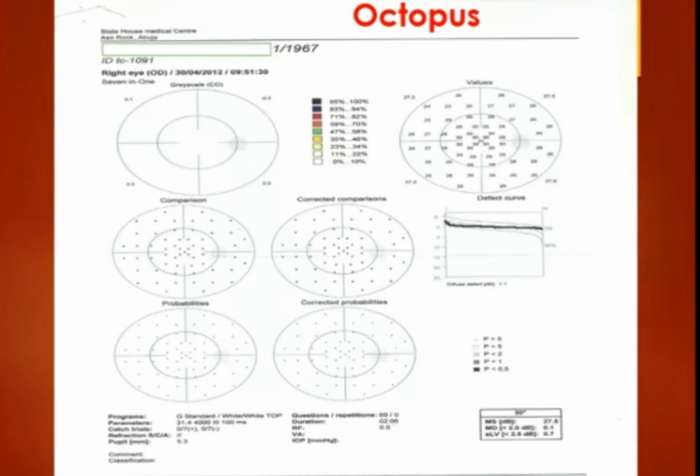Additionally, Octopus includes a Bebie curve to tell you the type of depression seen. So here is the Bebie curve. It comes with a shaded area, and the shaded area tells you the type of depression seen. Within the shaded area, a thick line runs through it.